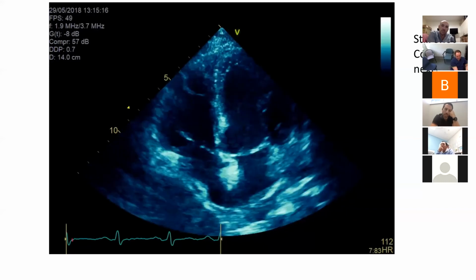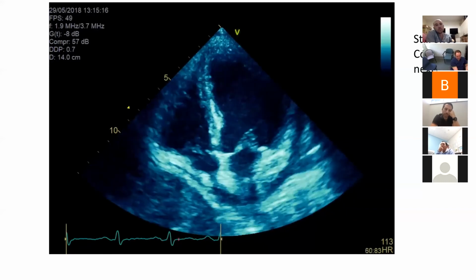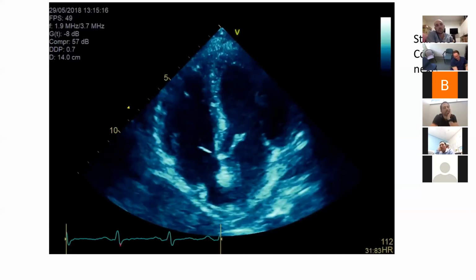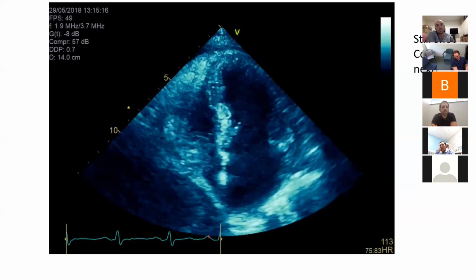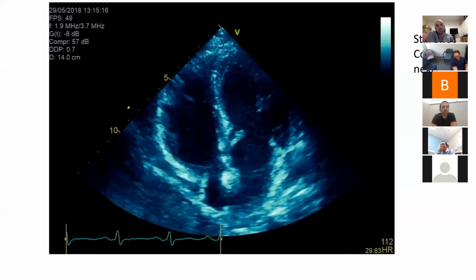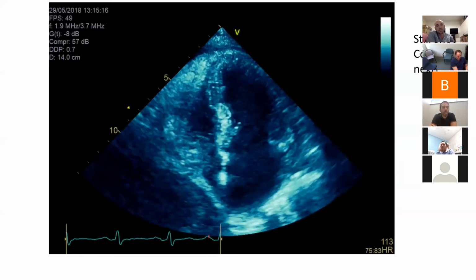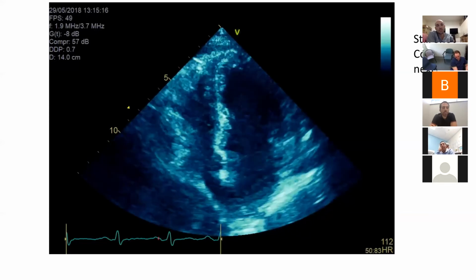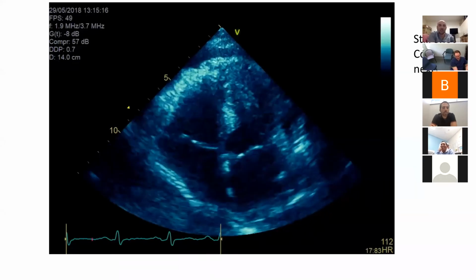Sorry, the temporal resolution is really terrible on my screen. And the right ventricle looks a bit, I don't know actually. It's like a Mexican wave, isn't it, from the atrium to the ventricle? I can't see that because it just jumps around.